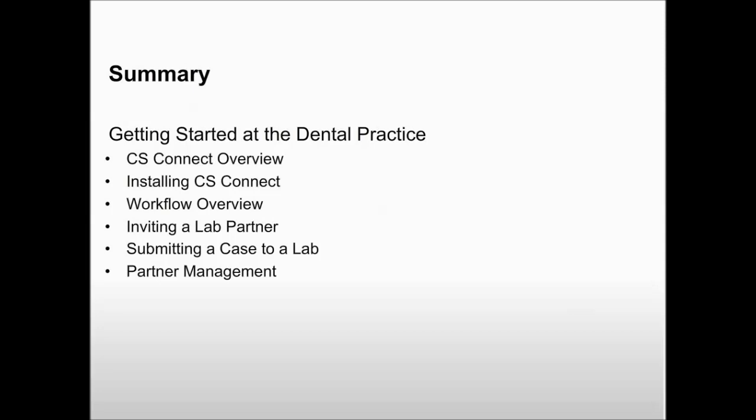This concludes the recorded class, CS Connect Getting Started at the Dental Practice. Now you should be familiar with the CS Connect software, and you should be able to install CS Connect, invite a lab partner, submit a case, and manage your lab partners in the software.